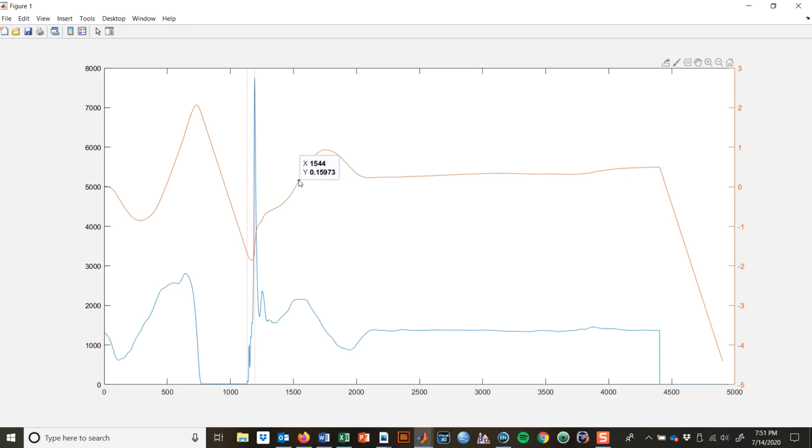Now, what I'm thinking is, and you can play around with this as you script, is that that's incorrect, because if we put that line down here on the force, you'll notice that there's a climbing in force right here before that point. So we actually hit the peak, we load, we attenuate, hit the minimum, and then we reload, perhaps like a recovery, before we actually stand up with more force and more unloading to kind of facilitate that standing up period.